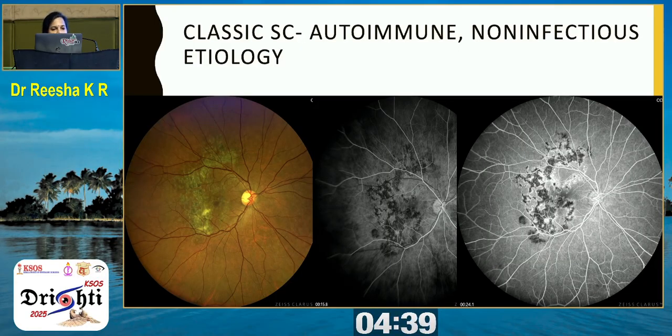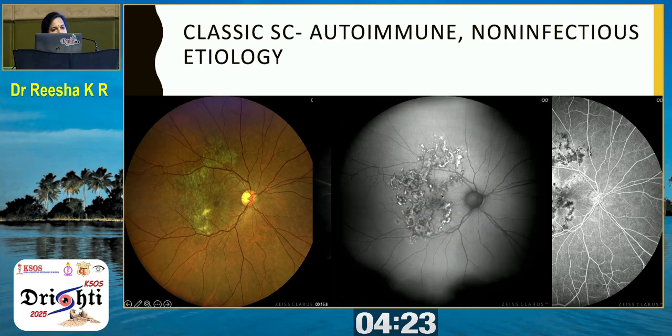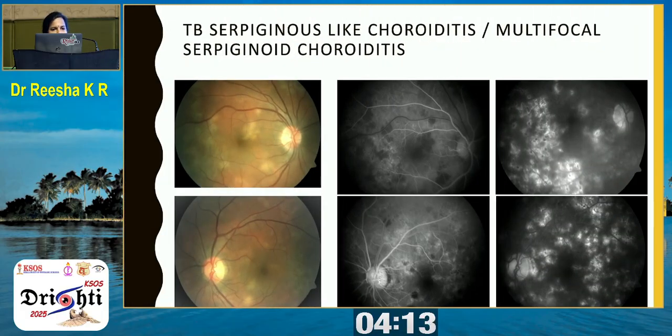Again, choroidal lesions appearing as yellow lesions in the posterior pole. The pattern is like a serpiginous pattern. This peculiar pattern is seen in serpiginous choroiditis. FFA shows early hypo and late hyper. Fundus autofluorescence will help in the identification of activity in serpiginous choroiditis.